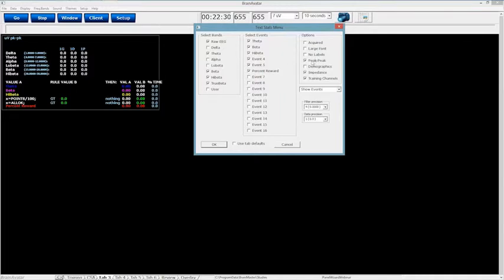Another option right here is you can look at the information that's coming in as peak-to-peak or RMS. Now you have to ask yourself, why is this option in here? Well, this is actually a great feature. This allows you to have two different bits of information looking at it in a different way. Meaning I can have my waveforms being trained as peak-to-peak information, but I can look at the information in RMS. When is that going to have its use? Well, that's going to vary from person to person, or even if it has any use to you. But it does have the ability to do that.